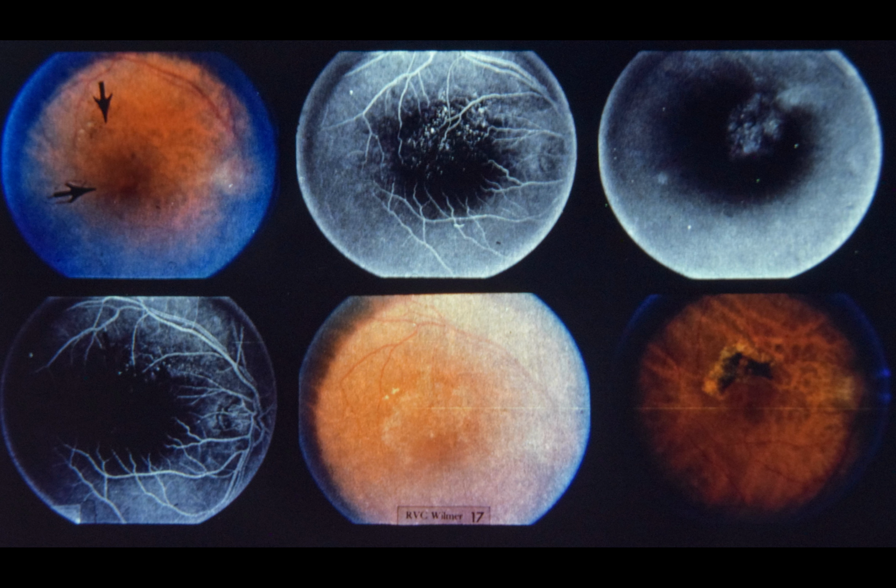Upper center, 29 seconds after dye injection, dilated capillaries and microaneurysms fluoresce. Upper right, 15 minutes after injection, note cystoid macular edema. No treatment was performed at time of initial evaluation. 3 months later, lower left, fluorescein angiogram shows extensive capillary closure has developed in area of macular branch vein occlusion. At this time, focal argon laser photocoagulation was recommended.